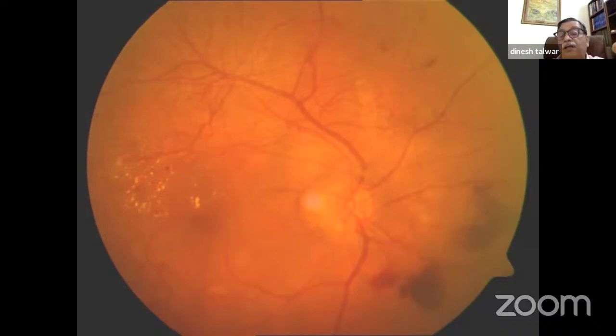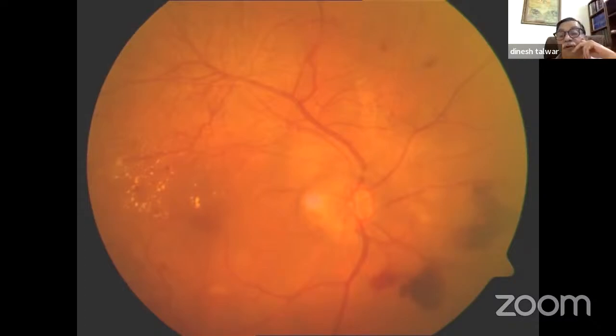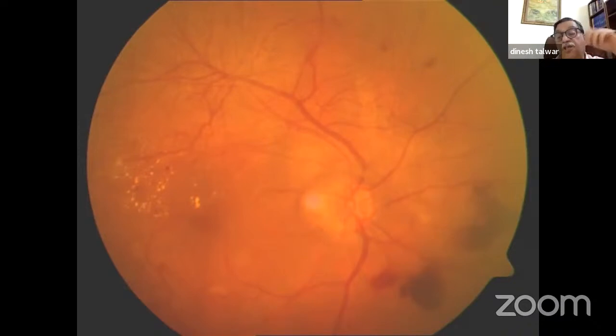Do you also see that here, what previously was being shown, the grayness, here you can see very clearly that the area is gray. Yes, sir. So clinically you can say that this is macular edema there, right? Yes, sir. So you can say suggestive of macular edema.